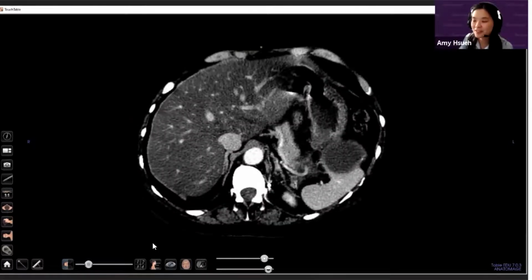So you can ask them questions like that, walk them through it, and then have them take the pictures, take the screenshots, mark it down, and present that, turn that in. So you find the liver, and you go, okay, this liver looks really weird. And then you can move on to the next thing that the radiologist found, which is the splenic cyst.